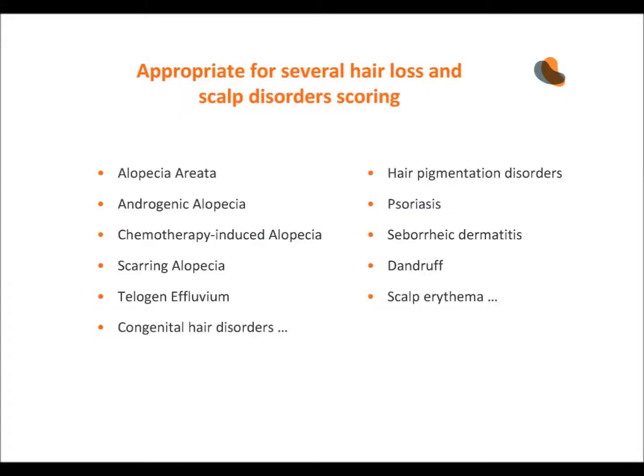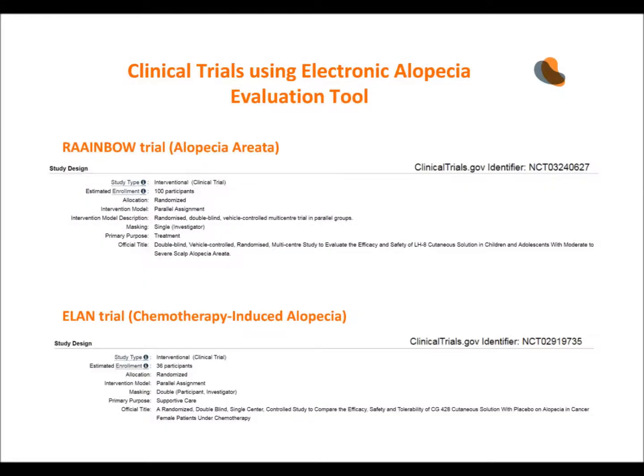This tool's versatility makes it appropriate for the scoring of several hair loss and scalp disorders. Thanks to its simplicity and accuracy, our electronic alopecia evaluation tool is appropriate for use at the physician's office as well as during clinical trials.